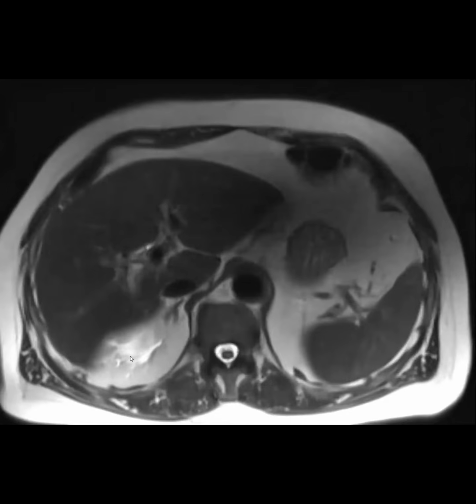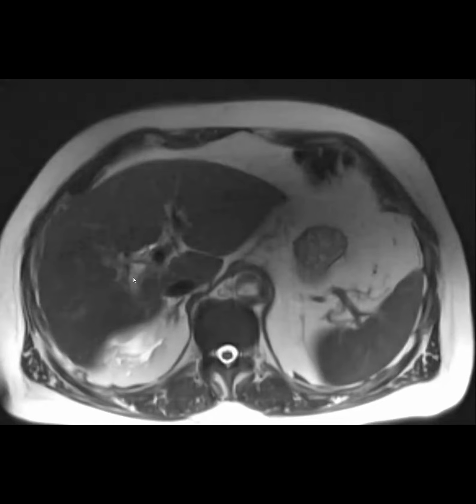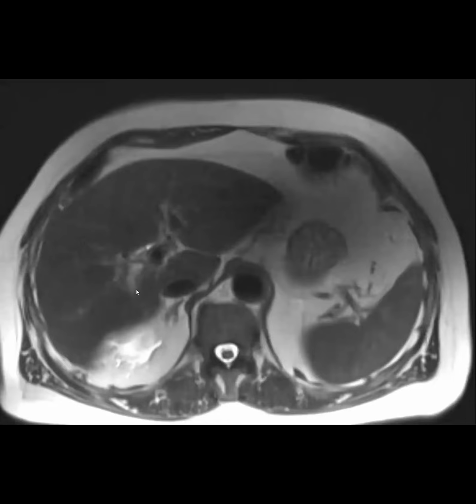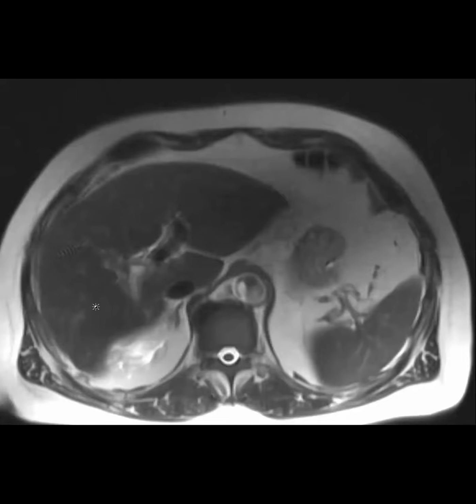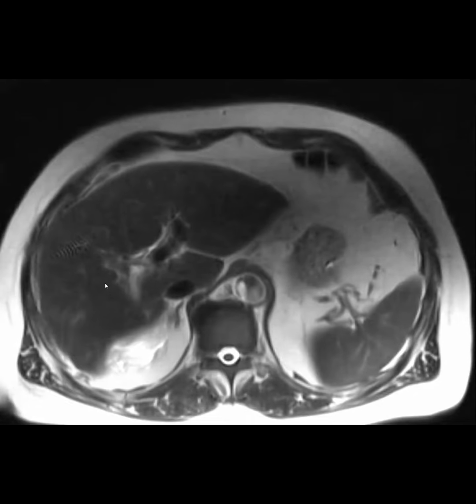We didn't have a post contrast, but there are things you can see on the flow void. This looks like thrombus here in the right portal vein. It doesn't look gray like a tumor. It's very bright, like pus. Let me see if I have diffusion. By the way, diffusion does not help because both bland thrombus and tumor thrombus will have restricted diffusion.